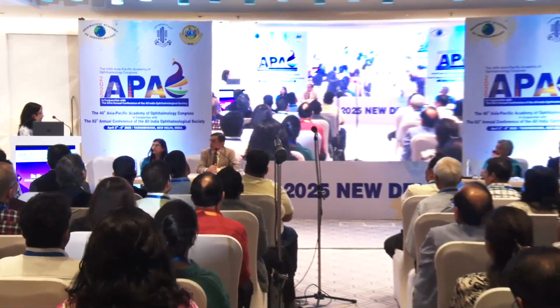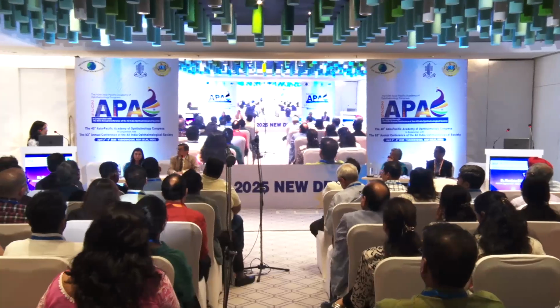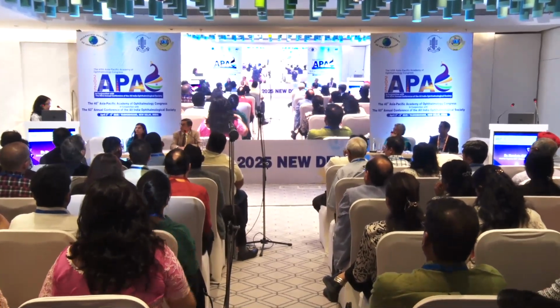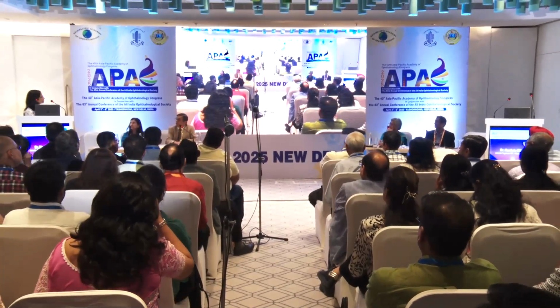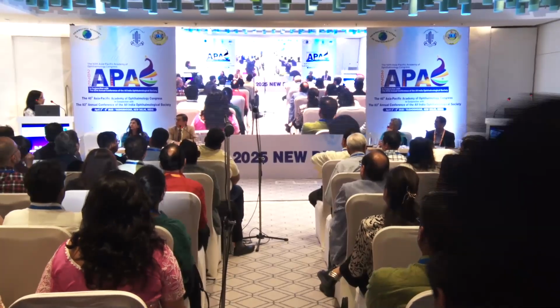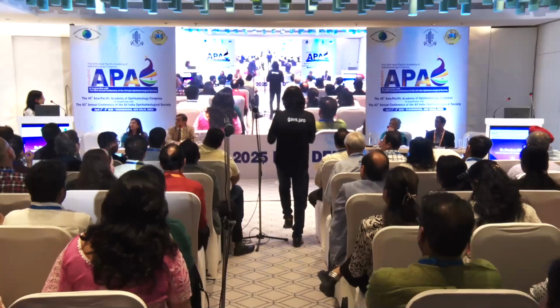So Hemlata, in your clinical practice, is there any particular situation where as a routine you plan that you have to do an anterior segment OCT before you go ahead? So we do it in all cases of trans-PRK, because epithelial thickness is measured and the same thickness we feed into the LASIK machine. So that is the precise removal of the epithelium. And then we do it in all cases of redo surgeries of LASIK because we need to know the depth of the flap. And then we do it in all cases of Descemet membrane detachments.